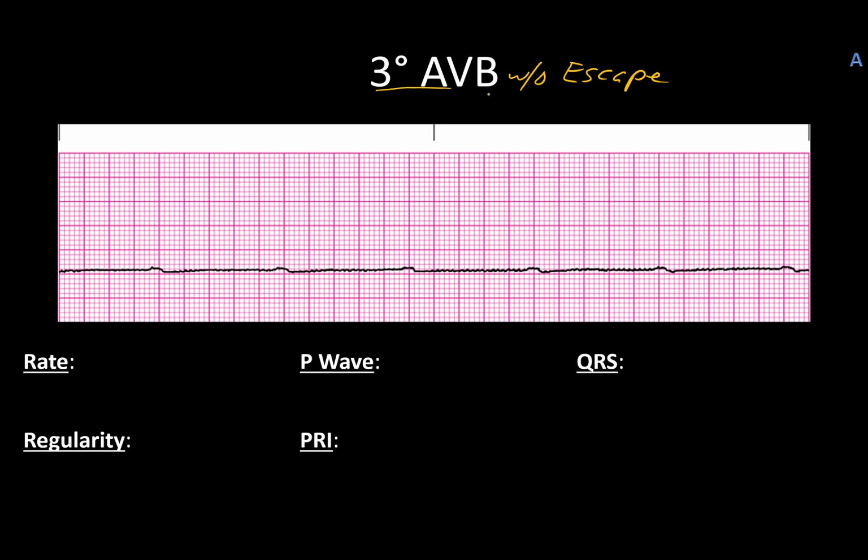It's also known as Ventricular Standstill, which is exactly what it is, right? The ventricles have stopped doing anything, but it's not asystole, because asystole would be a true flatline. In this case, you have atrial rhythm, well, at least atrial electrical conduction, but nothing beyond that. You're missing all of these QRSs through here.